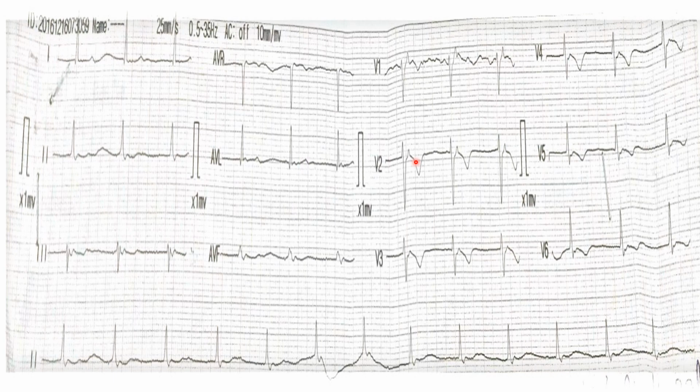Now we can see that the sinus activity is present on the ECG, but there are varying R to P intervals, like this is R, this is P, this is R, this is P. Now look, this is R, this is P. So there is no fixed pattern. So now the question arises, what is the driver of this circuit? Is this the V or is this the P? So how will we decide?